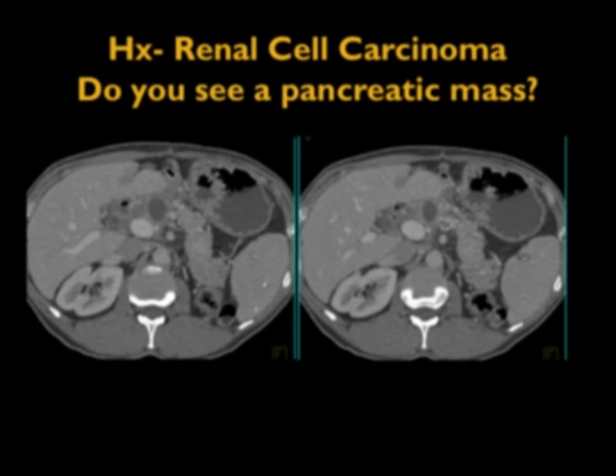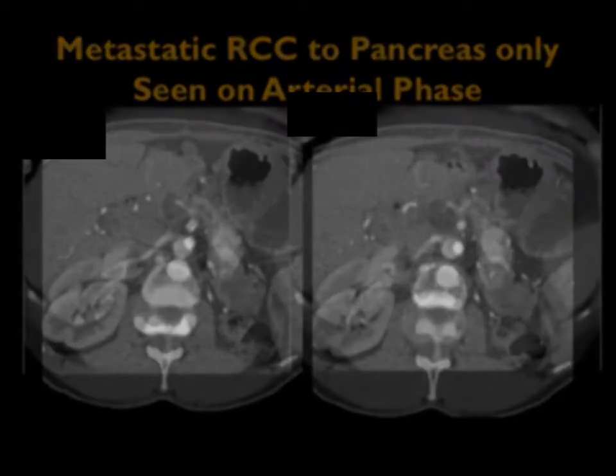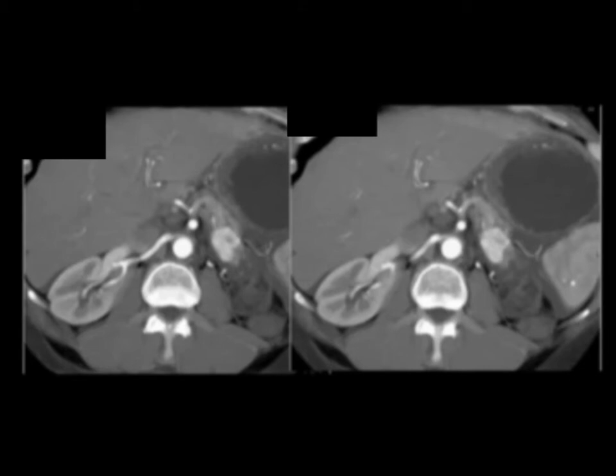Left nephrectomy is seen, pancreas falls posteriorly, spleen rotates posteriorly. But instead of this venous phase where everything looks great, I give you the arterial phase, and now you see the vascular lesion in the tail of the pancreas at the body-tail junction. That's a metastatic renal cell carcinoma to the pancreas, not uncommon 10 to 15 years post-nephrectomy and suspected cure. These patients will often get distal pancreatectomies in this case, or all sorts of different pancreatic surgeries, because interestingly, the only metastasis might be to the pancreas. But look how easy it was to miss that case, right?